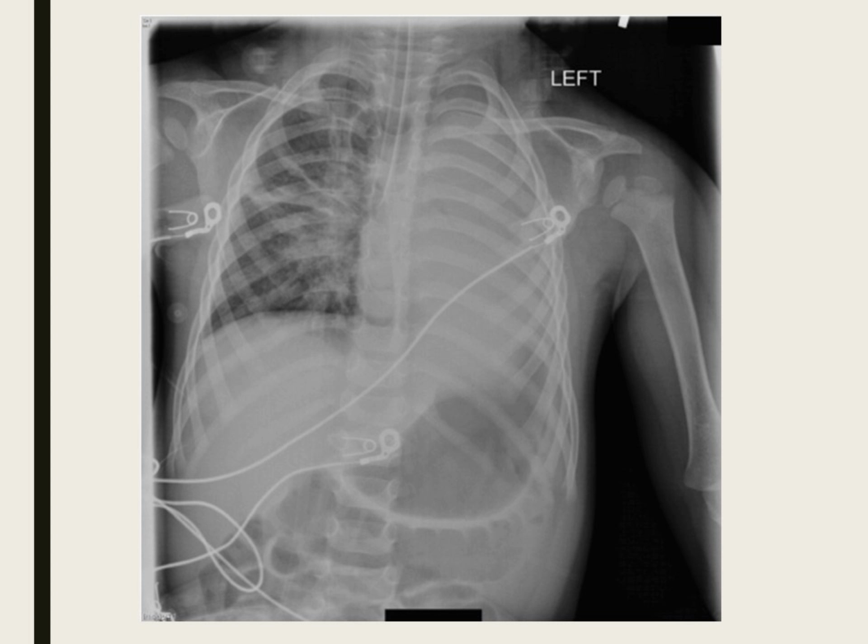C, heart. I don't even see the heart. What the heck is the heart? It's somewhere in there. There's something obstructing the heart, right? I don't know what it is, so I can't really make any assessment about the heart. Maybe there's a kind of prominence there on the right side. D, diaphragms. Well, you can see the right diaphragm pretty clearly, but the left one you can't, just like with the last one of the effusion, right?